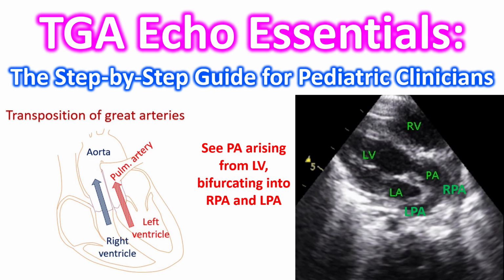In pediatric cardiology, an echocardiogram is the definitive tool for diagnosing dextrotransposition of great arteries, known in short as DTGA. For a clinician, the essentials involve more than just seeing the switched vessels. You must meticulously detail the coronary anatomy and mixing sites to guide the surgeon.